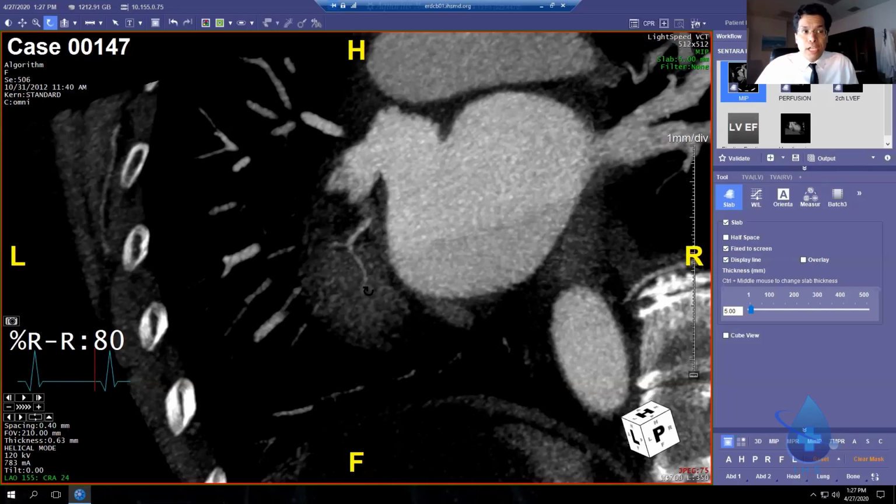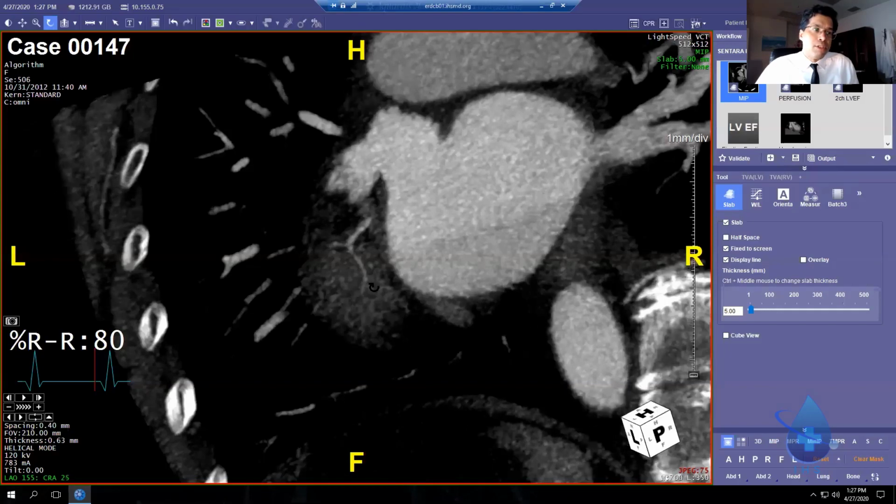But if you tell me today, Doc, Bhasin, I am not comfortable calling that normal, then great. That means you're a good cardiologist. How long have you been at this? Four hours? There's no way you're going to be comfortable until you see a bunch of cath films in this course, okay? So that's a normal circ.